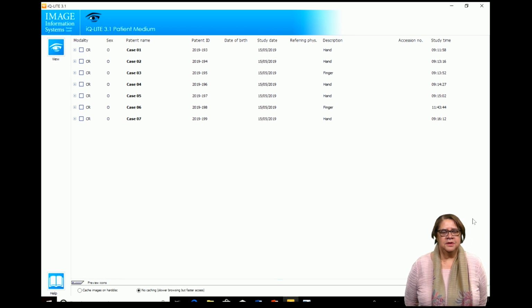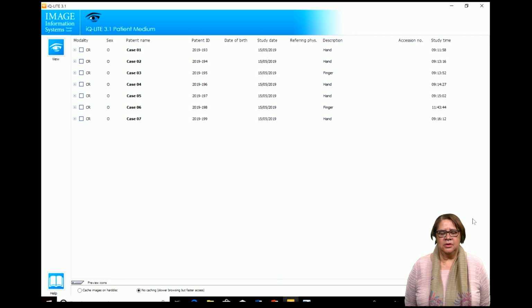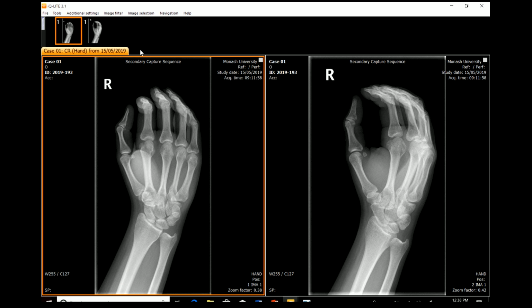This is the video feedback on the practice bank that I've given you for the hand and fingers. Please have your preliminary image evaluation form at hand so that you can mark your responses as we discuss each of these cases. The first case that we have is for a right hand. The indications for this case is the patient had an injury to the hand and the palm is very swollen.